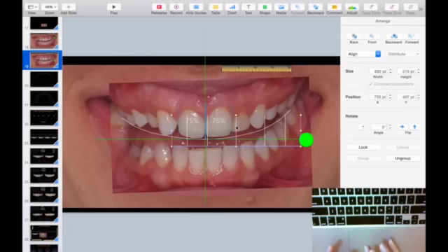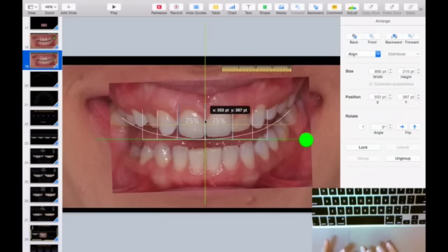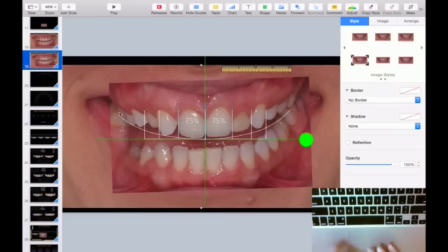And I'm going to try to place this here with my centrals. And I got here my proportion, what I have to see in a frontal view from the laterals, from the canines and centrals.